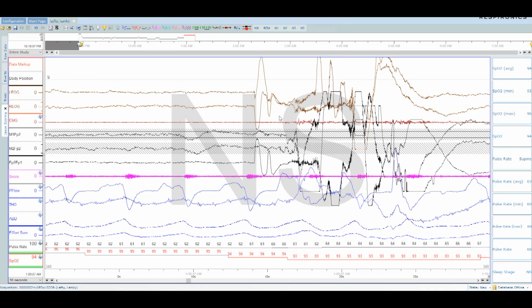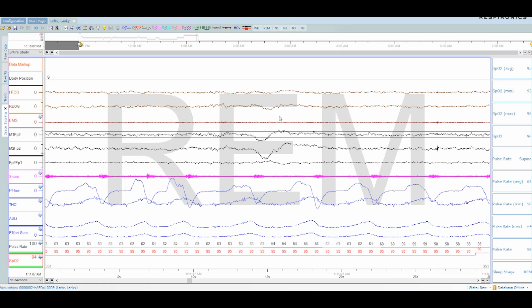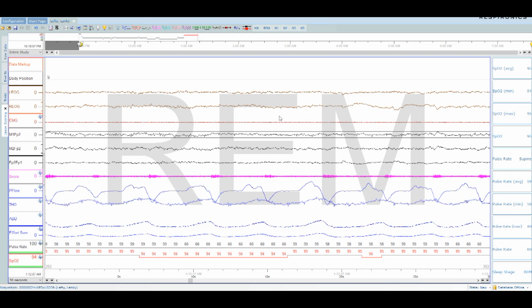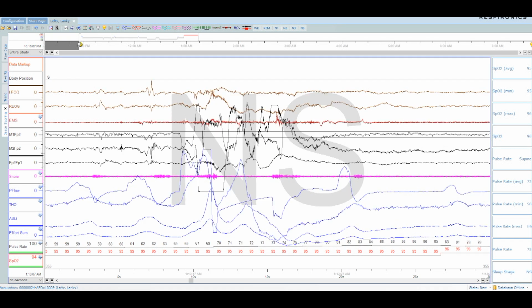So you guys, I had very nice REM sleep just for you. So we're going to keep it in REM. Why am I having so much REM for my first cycle? Unreal. That's a kind of a long period. My God. Mom, if you're watching this, I really am an overachiever. Every dime you spent on me was so well worth it. I'm kidding. That was stupid.